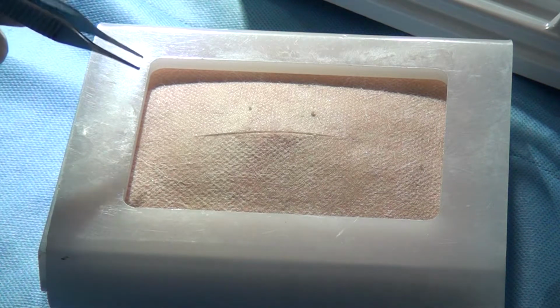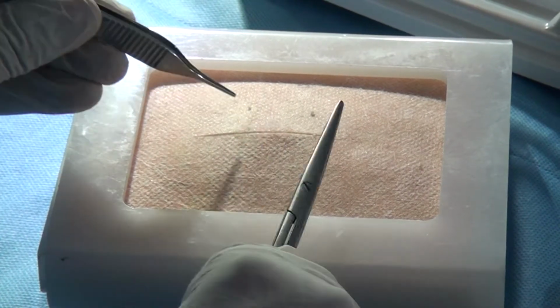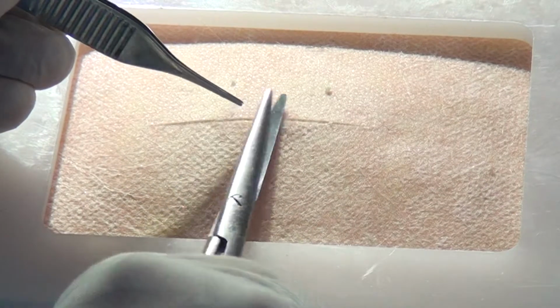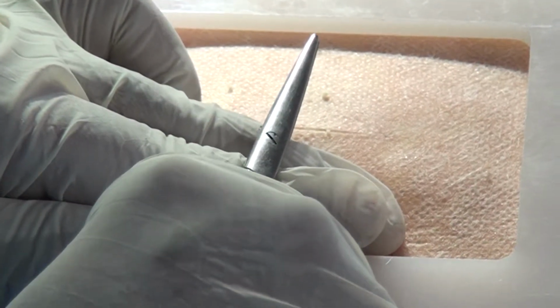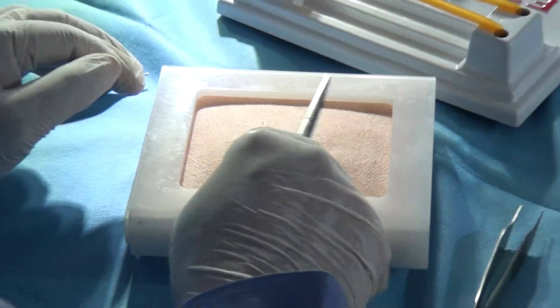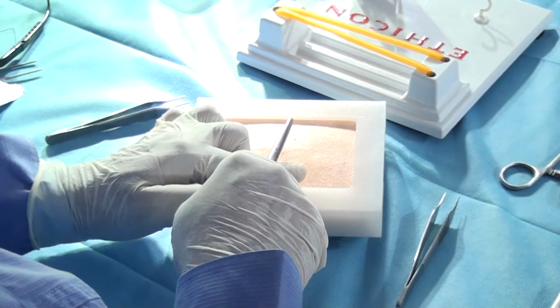Then why have straight scissors? Straight scissors are used if the space between the two ends of the thread is very narrow and we can't afford to have a curved cut. Then we use the straight scissors, and it is also used for cutting sutures. Whenever you are using scissors, remember to use your fingers to support it so that it is steady. We don't use it like this. Anybody cutting like this is actually a badly trained surgeon, a badly trained doctor. You should always support your scissors and then cut.